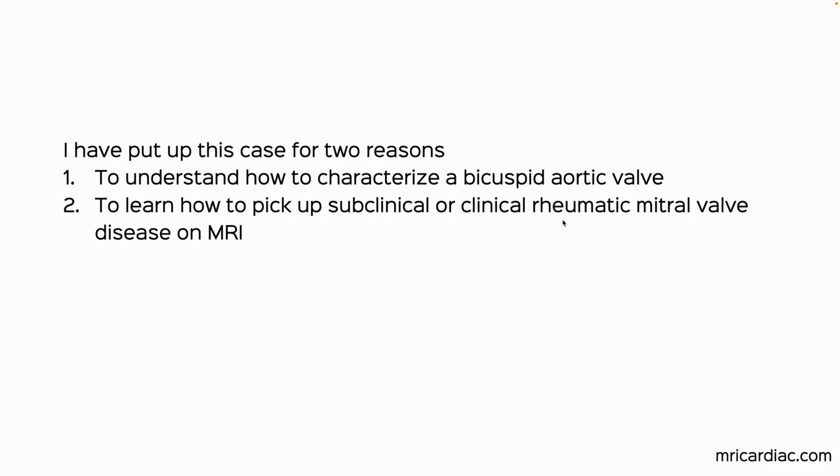One is obviously to reiterate how to characterize a bicuspid aortic valve. And it's just nice. In fact, I use my own presentations each time I get a case and just go through the steps so I don't have to memorize them, because they are all on my laptop. And similarly, now with the mitral valve, I have learned how to pick up subclinical rheumatic mitral valve disease.